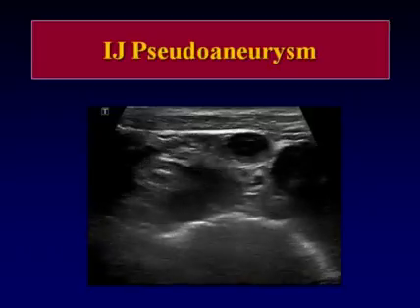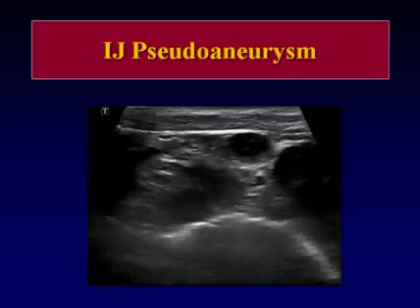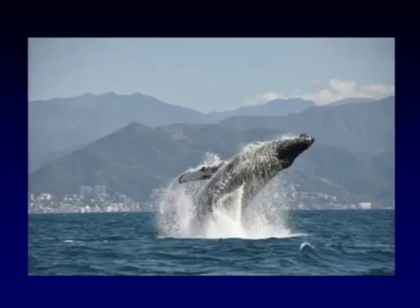So again, an unusual entity, rather dramatic images, but the important thing to keep in mind is that these are clinically of no significance and really do not require any kind of intervention. So with that, I think we will close our session.